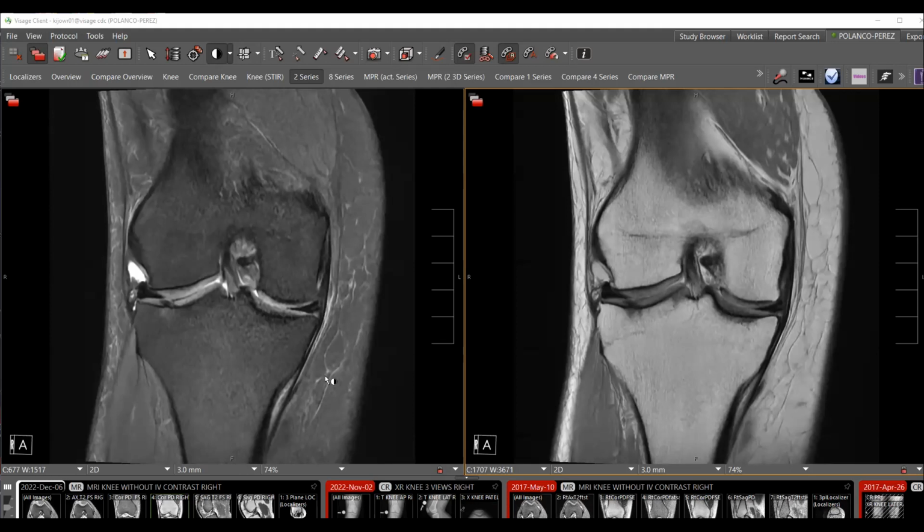In my experience, most cartilage fissures that I see in clinical practice consist of linear areas of low signal intensity extending through cartilage. Now, the reason why these cartilage fissures are low T2 signal is that the gap between the cartilage is not wide enough for enough free fluid to instill within the defect and be visualized as bright signal on T2 weighted images.